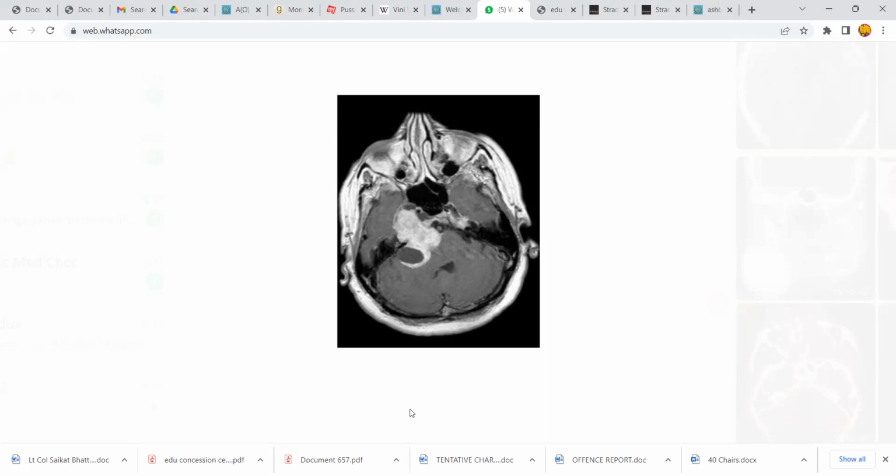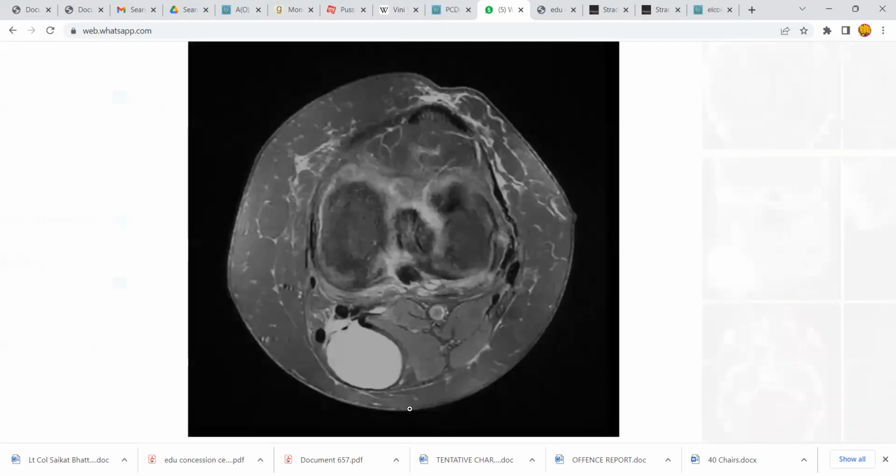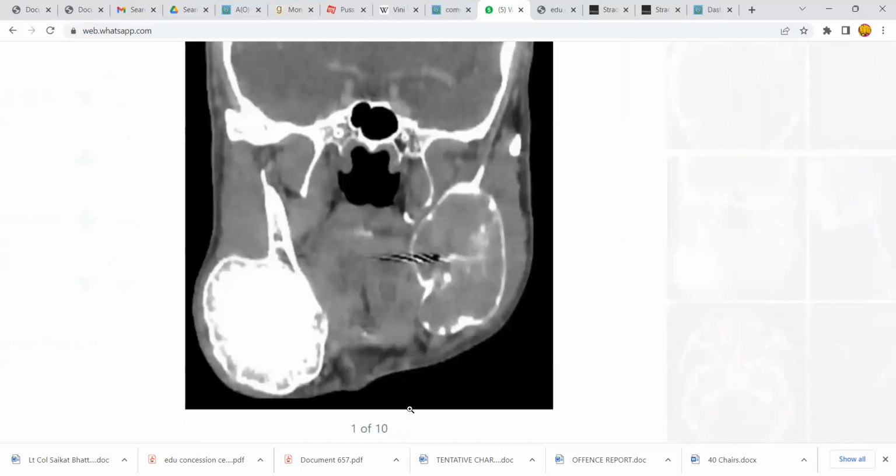Trigeminal. Yeah, this one is going from the prepontine cistern into the Meckel's cave. So this one is a right-sided fifth nerve schwannoma. Yes, Pratibha, speech bubble. Sir, Yogesh? Baker's cyst, Morant Baker's cyst, complete now. Yes, Nidish?